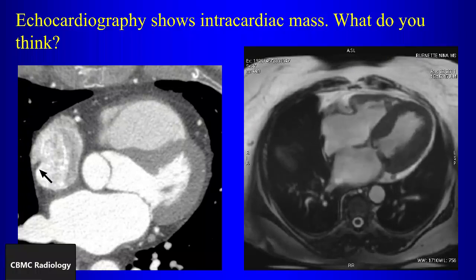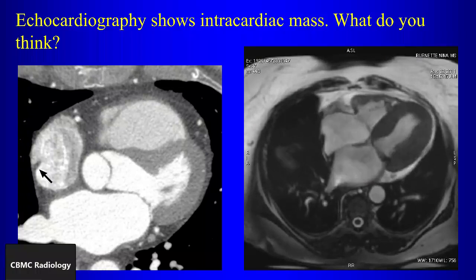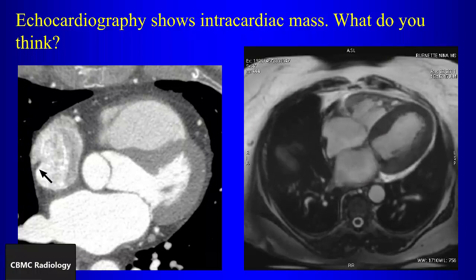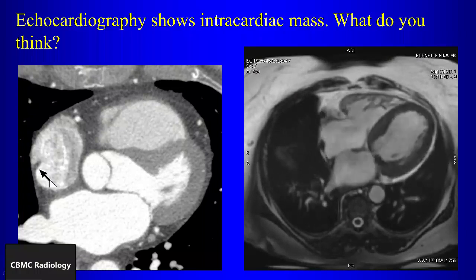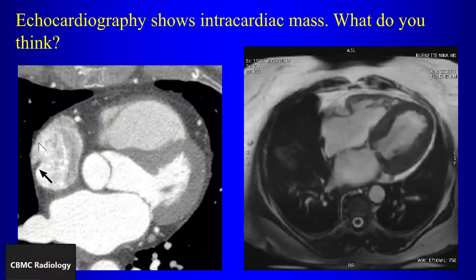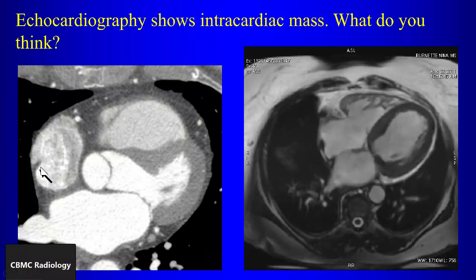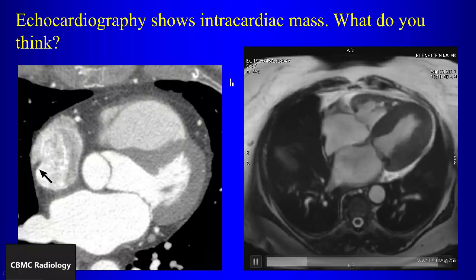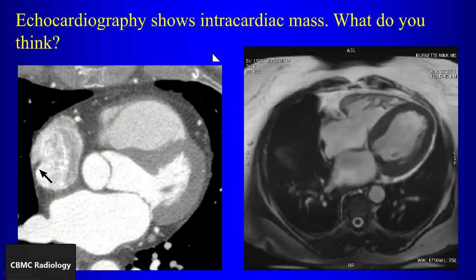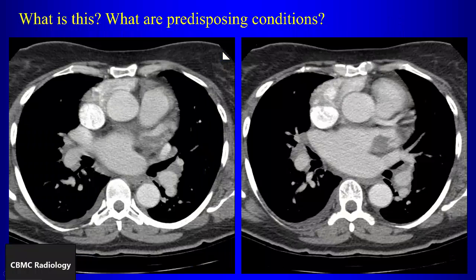It's an embryologic remnant, like a vein or something. So it results from the incorporation of the SVC and the IVC into the right atrium during embryology. So that separates the smooth portion of the right atrium from the trabecular portion of the right atrium. It's actually a ridge of tissue that extends along that line from the SVC to the IVC. So that is the crista terminalis. It is not anything abnormal, so you don't want to mistake that for a tumor or a blood clot.